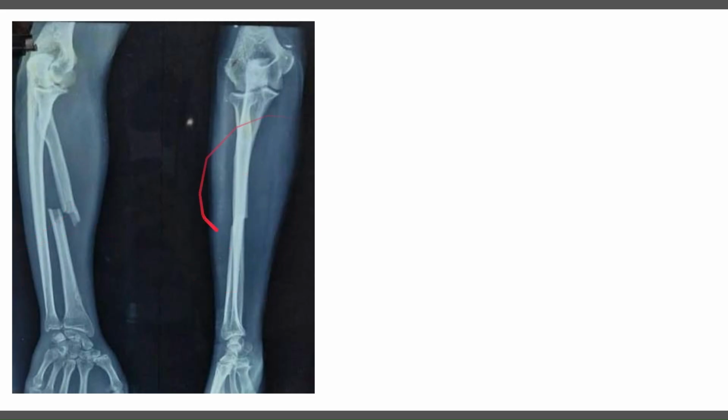And on this lateral view, again, one clue is the thumb. So the dorsum of the hand is this way. The palmar side or the volar side is this way. And so which way is this fracture displaced? So we have the radius here. We're going to walk, walk, walk, walk, walk. And we're moving this way. And this direction is dorsal. So on this plane, we have a dorsally displaced middle third radial shaft fracture.